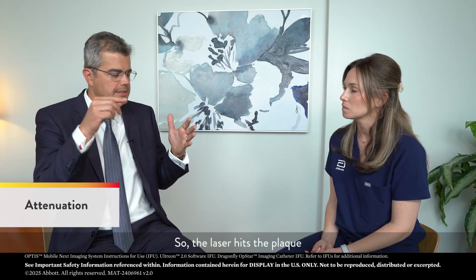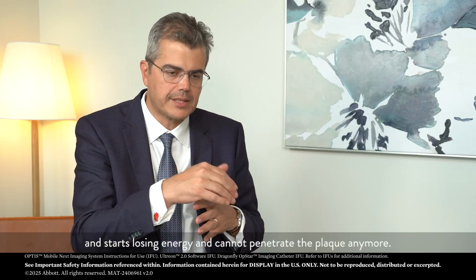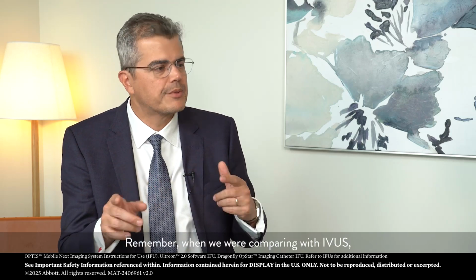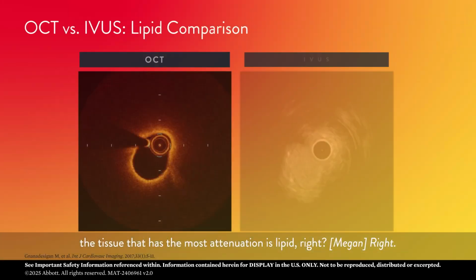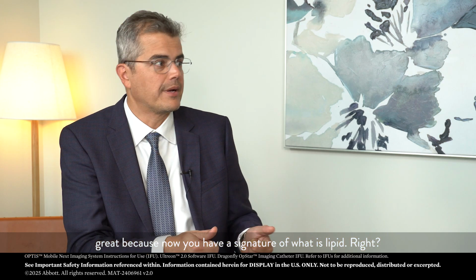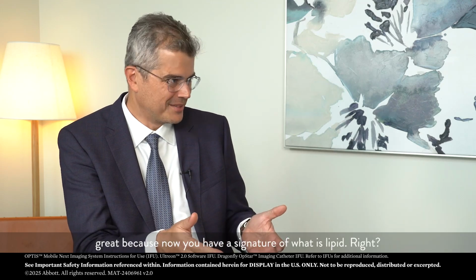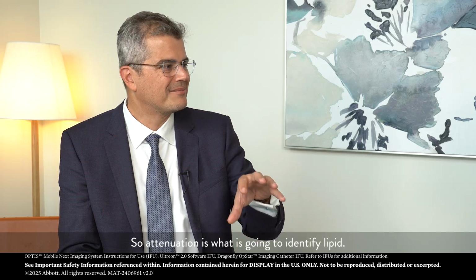So the laser hit the plaque and starts losing energy and cannot penetrate the plaque anymore. Remember when we were comparing with IVUS, the tissue that has the most attenuation is lipid, right? So OCT cannot penetrate lipid. Great, because now you have a signature of what is lipid, right? So attenuation is what is going to identify lipid.